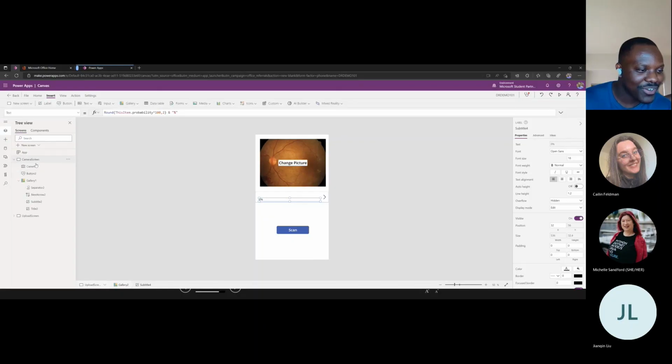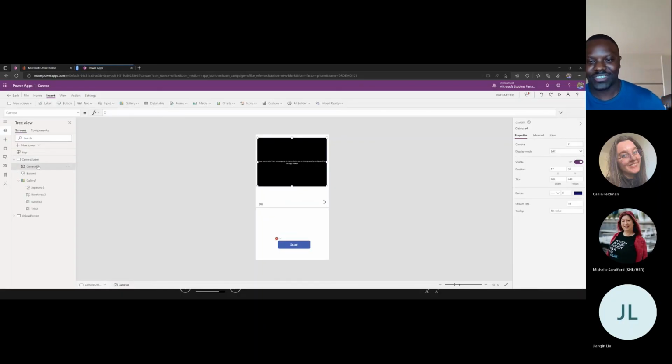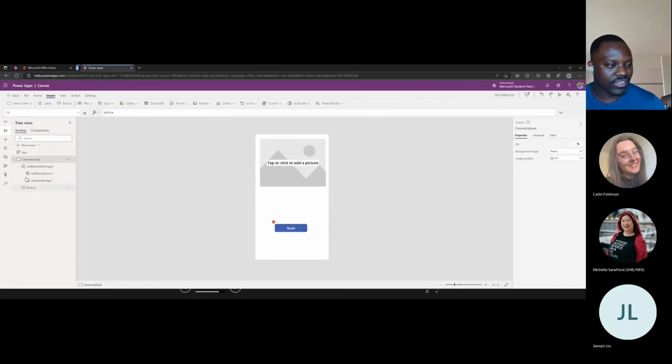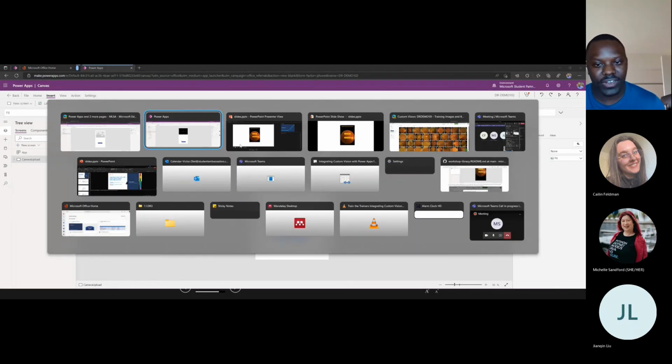You know what? I'm pretty sure I connected it. It'll show you my room, but I think I just want to make sure it works. So that's the camera. Two would be the source. It will not work because I am using my camera on Teams. But yes, you can connect your camera input there, and you should be able to see a live image from your camera. So you can create screens, and you can make a fully fledged app if you want to.